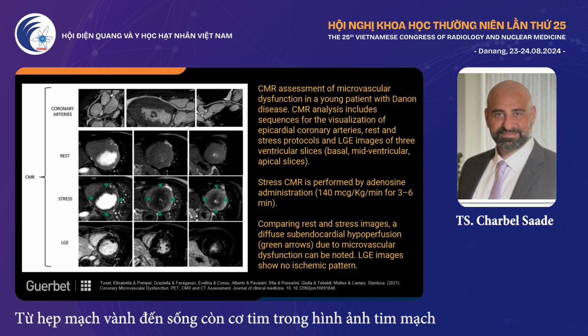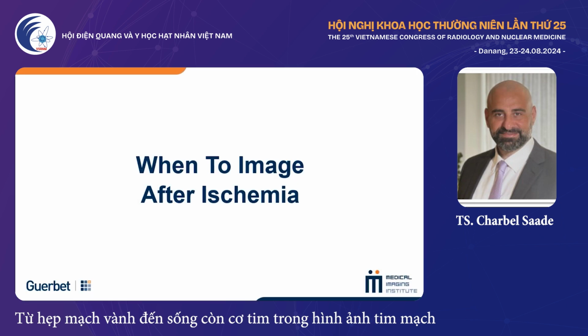Patients that end up having stress perfusion through coronary MR, at rest, it doesn't show that there is anything. On stress, it does show there is minor. However, when you look at late gadolinium enhancement after recirculation, again, there is no microvascular dysfunction and it shows no ischemic pattern. And remember, this is critical. At stress, it will show you this, usually 5 minutes, LGE 20 minutes. We image after ischemia.